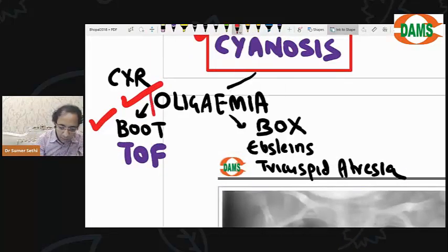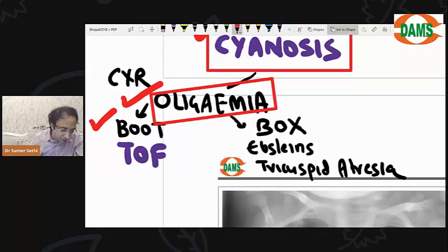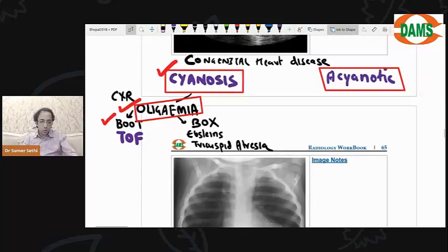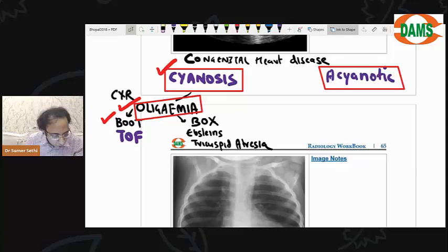थोड़ा सा पीडियाट्रिक्स का पार्ट भी कर लेते हैं, बहुत जरूरी है. And this is what they asked in the last exam, please see very carefully, है ना. ओके, ऑलिग मतलब कम, इमिया मतलब ब्लड. लंग्स में ब्लड वेसल के निशान कम है तो इसे ऑलिगीमिया. ओके, डू यू अंडरस्टैंड? लंग के अंदर ब्लड वेसल्स दिखेंगी ना एक्सरे में व्हाइट व्हाइट लाइंस की तरह, वो कम होना ऑलिगीमिया. Reduced vascular markings in the lungs is called as oligemia.